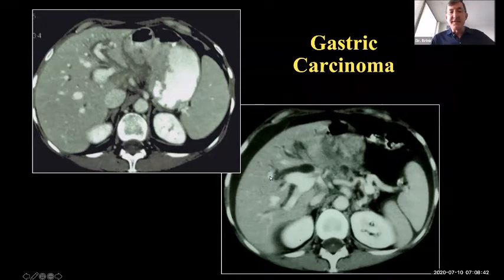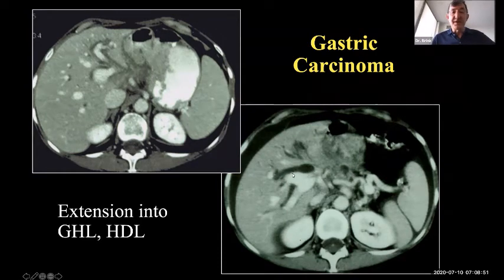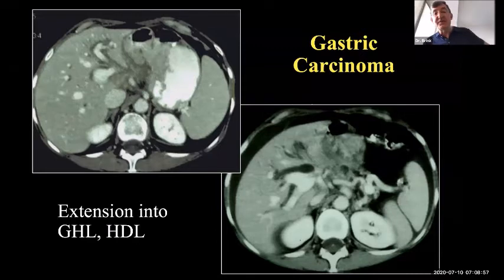And what is that complication? I'm sorry, we're not in person to answer these questions, but you can answer at home. Effectively, we're seeing biliary dilatation, and that means, of course, that we have tied up the bile duct with tumor, meaning that the disease has spread down the gastrohepatic ligament to involve its free edge, the hepatoduodenal ligament.